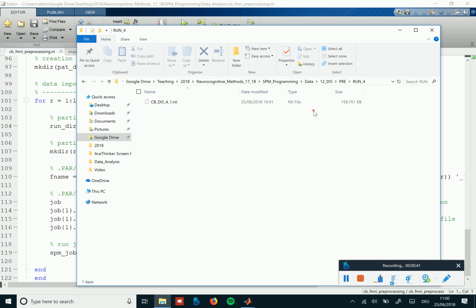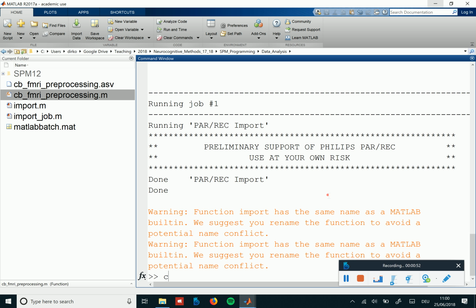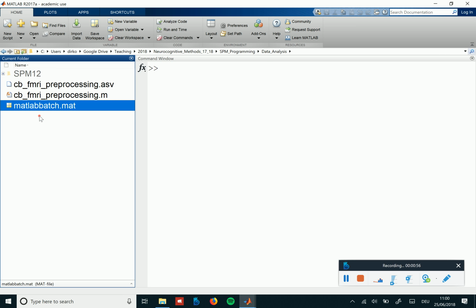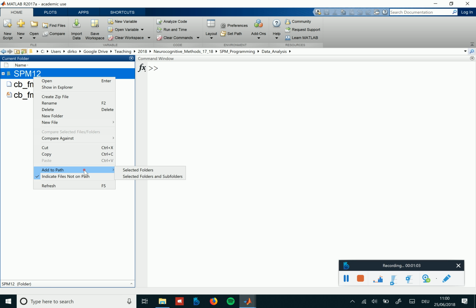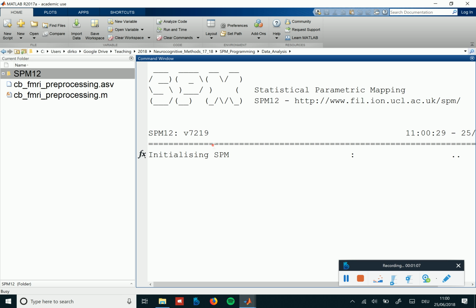And the next thing that we have to do to make SPM happy about how to interact with these files is to split that up. And from now on it's always the same thing, so we can actually get rid of our import here so that we don't get this warning anymore, and also this. It's always the same thing essentially, so let's see how often we repeat it in this way, because at one point I might just copy and paste, but maybe not.